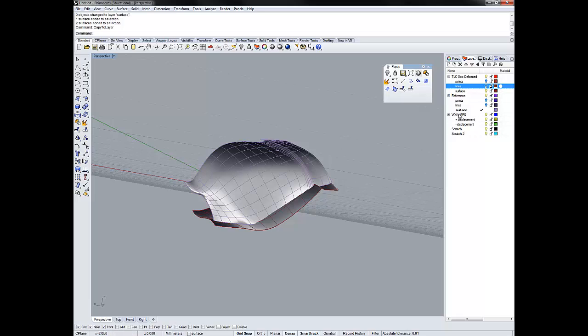What you notice is that you still have the purple, which is the reference surface, and you still have the red, which is the occluded deformed surface. But you also have this other one. So when I click to here and turn off the surface and the surface for the TLC occluded, you see that you have these 2 surfaces.